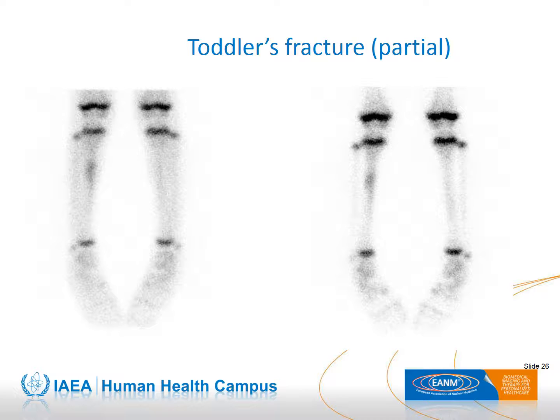Sometimes the fracture is less extensive, creating only oblique hyperfixation on the middle third of the diaphysis.